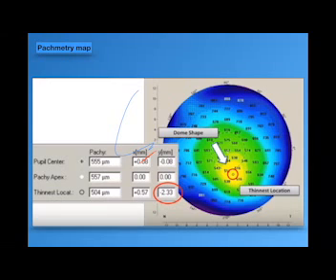Normally, the thinnest location should be at the apex of the cornea. If it's shifted away from the apex of the cornea, you have to consider the difference, and you have to consider the distance between these 2 points. We have vertical deviation and horizontal deviation. Which of them is more important?